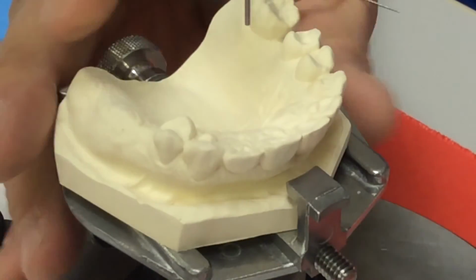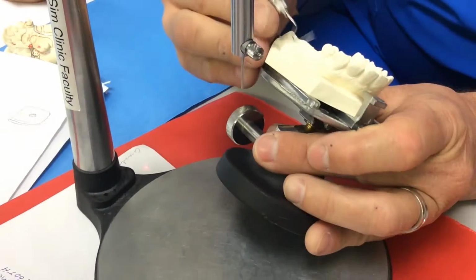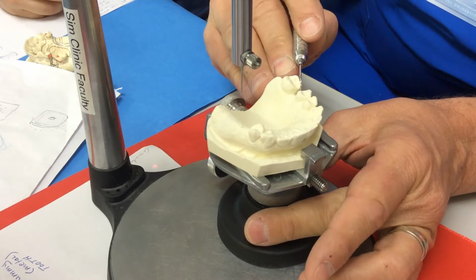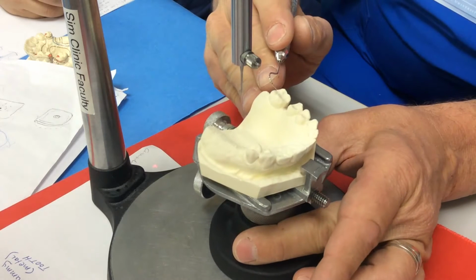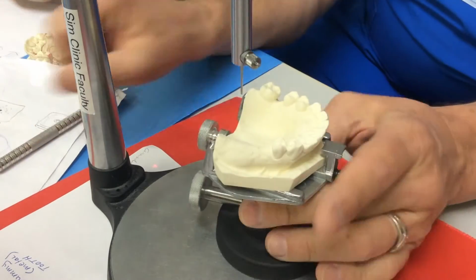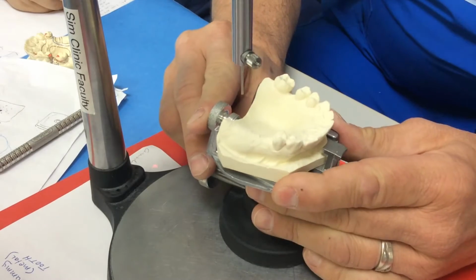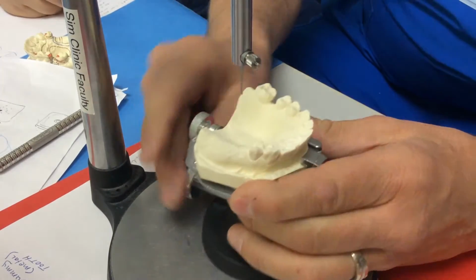But when I'm determining my tilt for all of that, the things that I need to take into account is I need to find a distal guide plane, and I need to find a mesial guide plane. And I need a distal buccal undercut on the molar for my clasp, and I need a mid-buccal undercut on the premolar. So I'm looking for that tilt that's going to give me the best. So the first thing I'm going to do is the anterior-posterior tilt, looking for the guide planes.